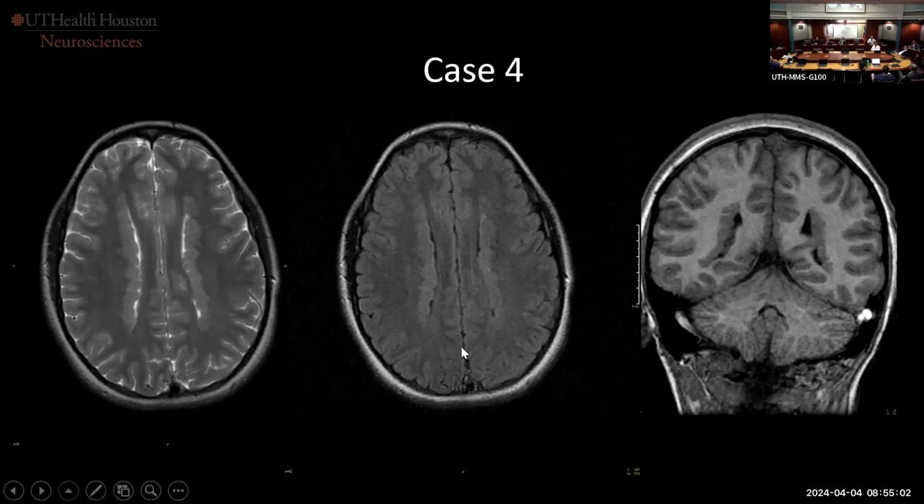Okay, so this one, case 4, we're done, guys. I told you it was case 4. So you see a lot of this. These are the ventricular ones that are easy to miss. When we are rushing through cases, I can see how we can miss them. Sometimes you just have little spots here and there, and those are so tricky. They're extremely tricky if you don't know what the patient is having and where it's been triggered. Sometimes it's not easy, but this one is just plain.